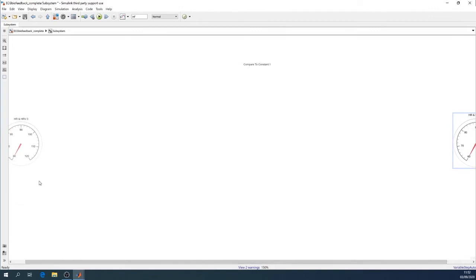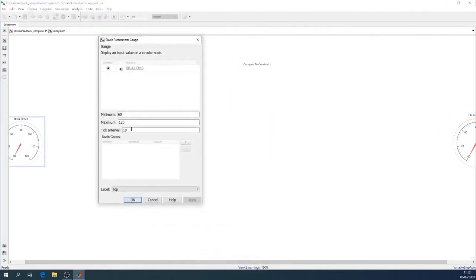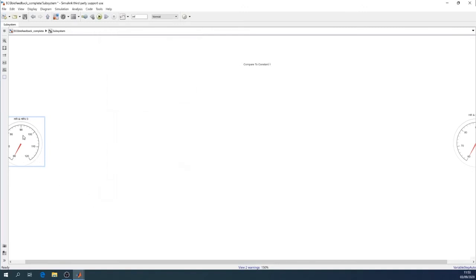You can also put the value with a new display block, which is now in development, will be released very soon. If you want to see the values, but this is good enough. You can obviously delineate these values with an error, but I use 60 for 120 because it would fit most of the situations. And then you can have this interval in 10 or 5 or more. If you put too small interval, then you will have to resize the gauge to a bit larger image.